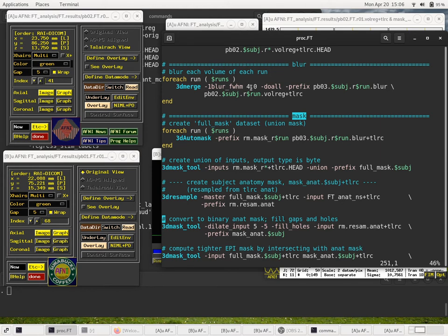And keep in mind that if your group analysis will use clustering, then the less you blur, the smaller your clusters will need to be at the end. Pluses and minuses either way. But again, 1.5 to twice the voxel size.